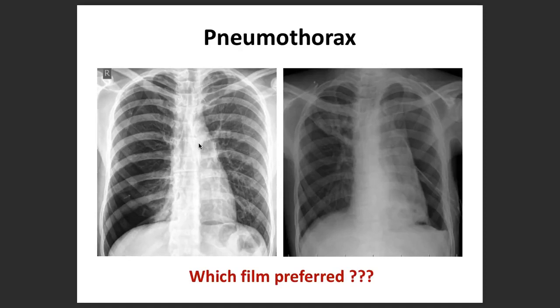What happens is you should try to look for the outer margin of the visceral pleura and lung. So what is the pleural line? If you are able to see the pleural line, run, run, run, emergency. You should immediately start arranging the things with which you are going to intervene. A lot of times a procedure has been done, an ablation procedure or a cath procedure, and then the patient complains of shortness of breath.